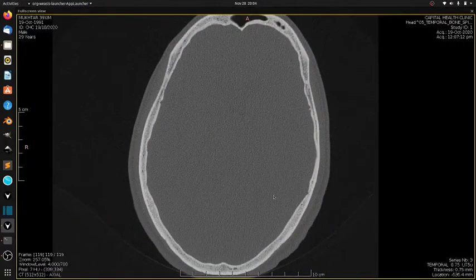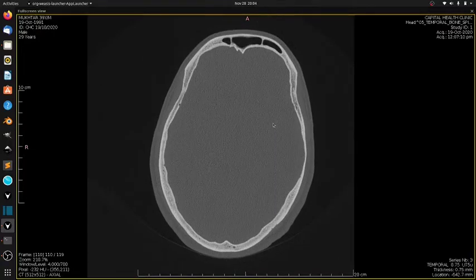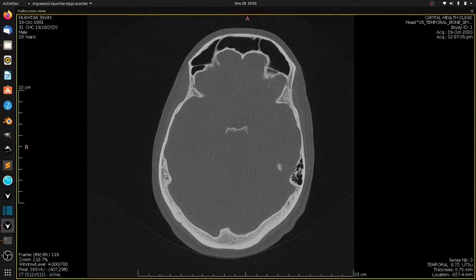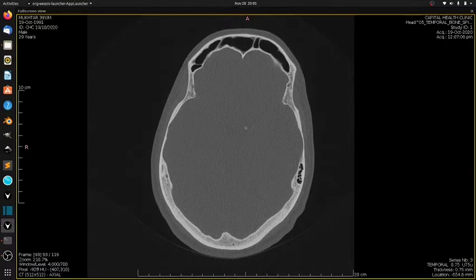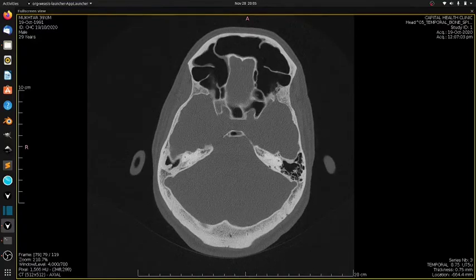This is the cranial cavity and this is the frontal sinus. As we descend down, you will start seeing the pneumatized bone over the temporal part of the temporal bone, and this pneumatized part is called the mastoid. These are the mastoid pneumatization here. The temporal bone consists of four parts basically: the mastoid, the petrous, the squamous, and the styloid. The first pneumatization seen on the temporal bone is the mastoid air cells, and followed by that you will get the petrous part.